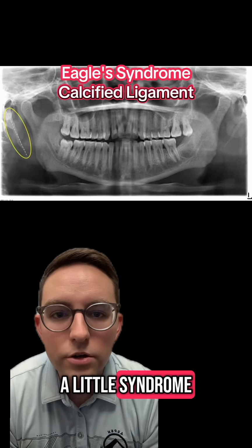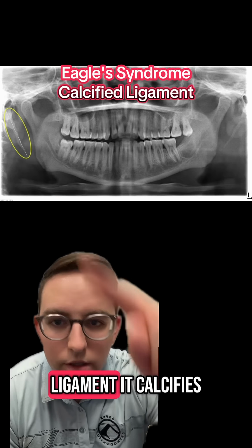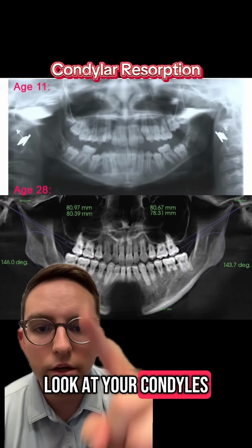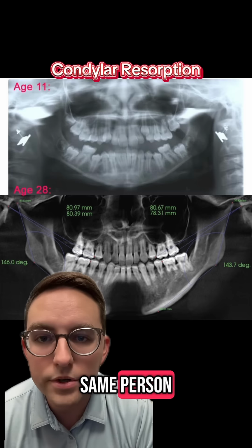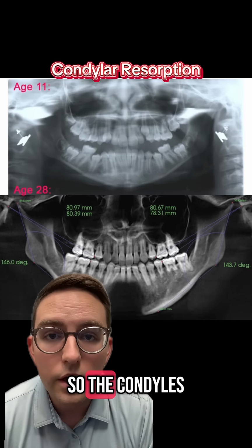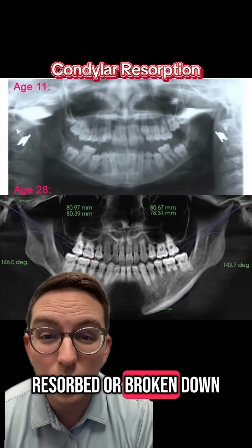Next up is a little syndrome called Eagle syndrome on the stylohyoid ligament. It calcifies, and then you can see it in the x-ray. So we're going to look at your condyles. So on the edges of the jaw, your condyles. At age 11, 28, these are two different x-rays taken of the same person. They were able to notice condylar resorption, so the condyles of the mandible, your joint, had resorbed or broken down.